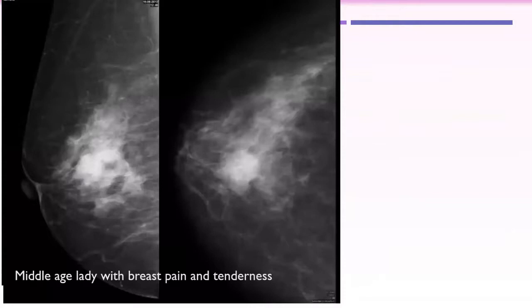Medina, it is your time. Okay, this is the CC and MLO of the right breast, showing a central retroareolar hyperdense mass with a different density within it.